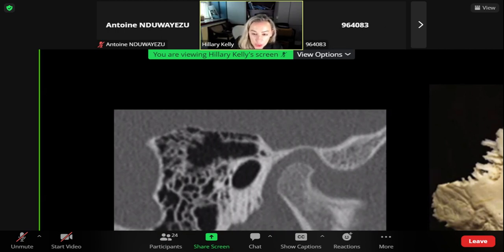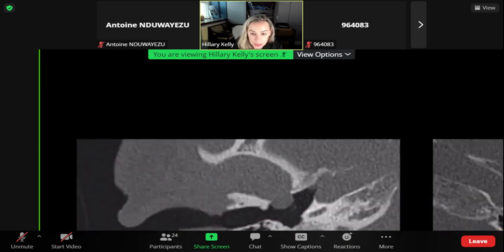There's considerable ambiguity in anatomic descriptions regarding terms like the petrotympanic fissure, tympanosquamous fissure, and Glaserian fissure. Regardless of what you call it, the arrow here indicates the junction between the tympanic and squamous portions of the temporal bone along the EAC. So that's a normal fissure, a normal junction there. And in kids, it might look like a line or a defect.